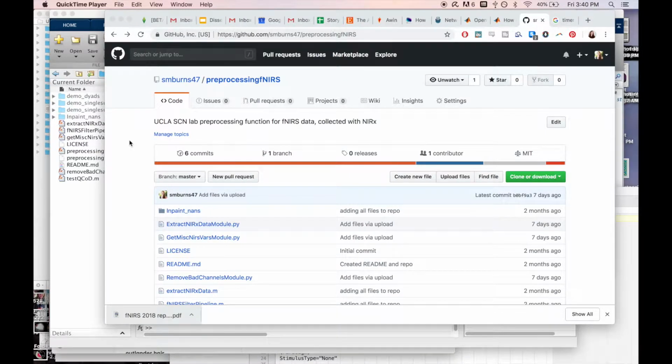Okay, so this is going to be the video that talks about how we use the pre-processing scripts that we currently use in our lab, how to run them, how to organize your data for them, and how to understand what they're doing and what's coming out of them.